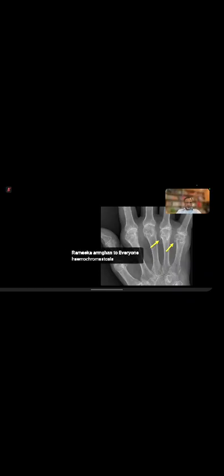Very good, Vishnu. So how does hemochromatosis lead to this appearance? It is right.